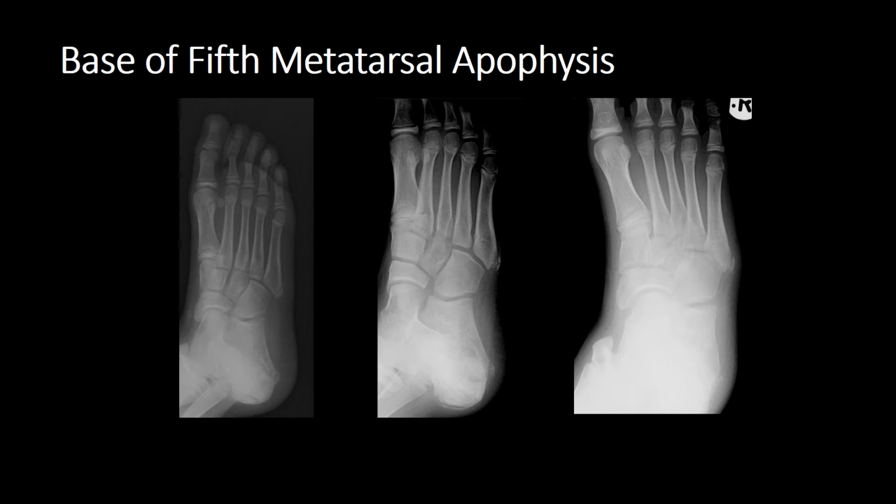Base of fifth metatarsal apophysis. This, like os subfibulare, is frequently mistaken for a fracture. So, how to tell a base of fifth metatarsal apophysis from a base of fifth fracture? Is quite simple.